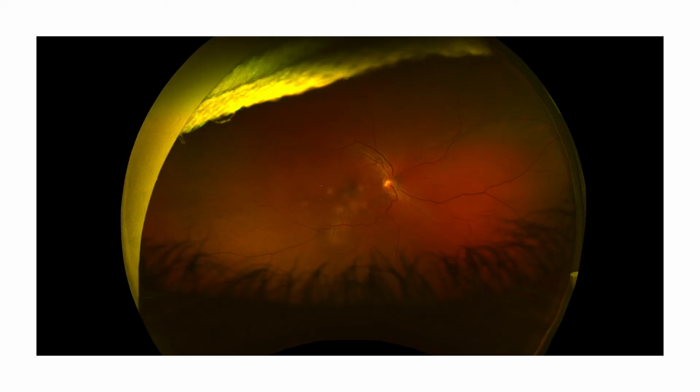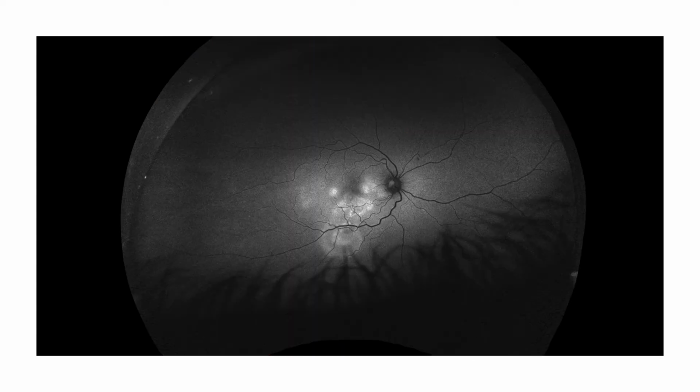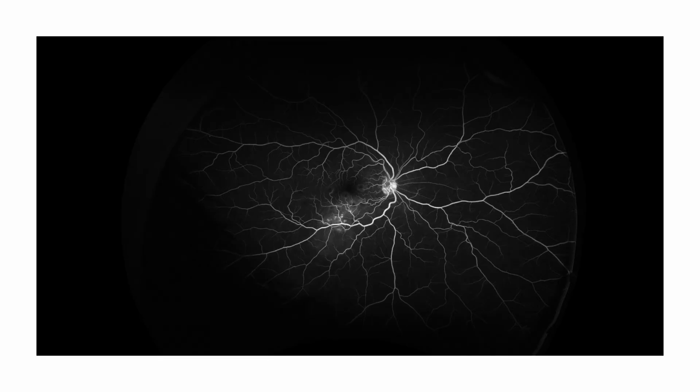This is a picture of the right eye. You can note the multiple chorioretinal spots, as well as the localized area of inferior serous detachment. The left eye exam is more dramatic here again, with multiple intraretinal hemorrhages, chorioretinal spots, multifocal serous detachments. An autofluorescence shows hyperautofluorescence around the chorioretinal spots, as well as delineates the area of serous detachment. In the left eye, much the same, there are areas of hyperautofluorescence that both show the chorioretinal spots and the areas of serous detachment.